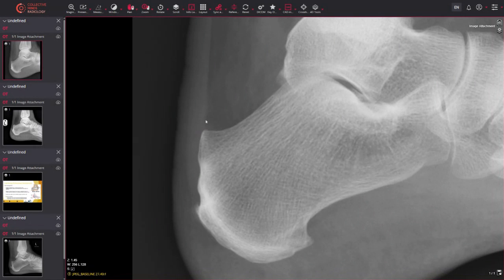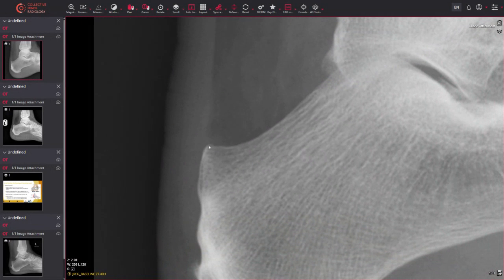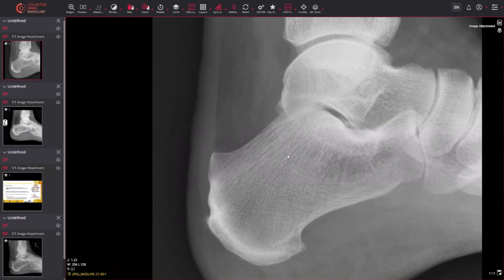You get repetitive strain here at the bursa, and the bursa becomes inflamed. That leads to wear on this section of bone here, and you start to get sclerosis and new bone formation, or a small spur forming up here, so it's quite triangular in shape. This is called Haglund's deformity. Okay, so this is secondary to bursitis, as I've said. It isn't particularly prominent in this case. I've got another case though that'll show it better.